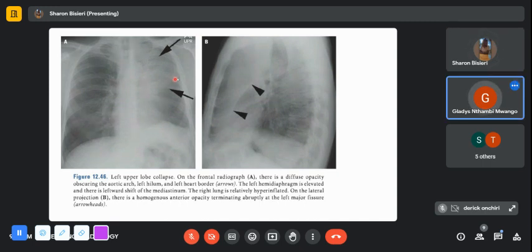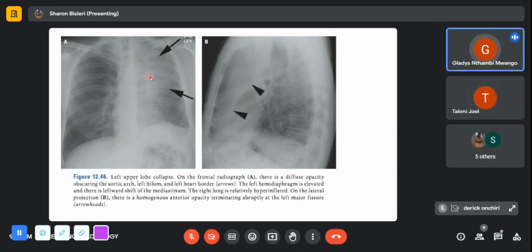Anyone? Any offers? Why do we see it more clearly? The arch of the aortic knuckle. There's air around it. There's air outlining it. Yes, why? Pneumomediastinum. No.